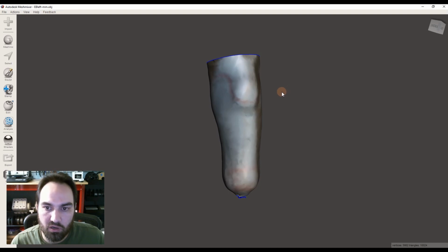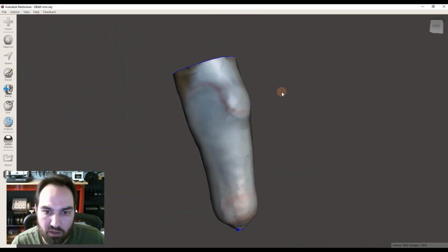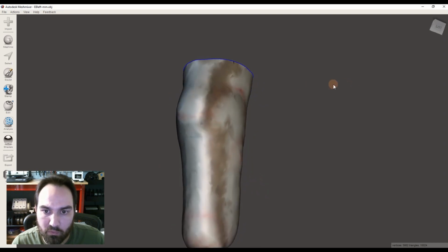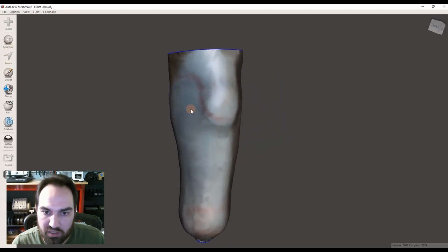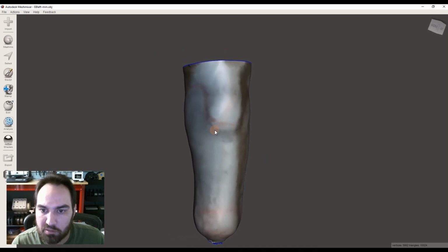I use something called a space mouse from a company called 3D Connexion. And that allows me to rotate and move the model freely with the space mouse, which is in my left hand, while my right hand is free to use the tool based on whatever I'm using at the time. So that really speeds things up and makes designing a lot easier having that space mouse there.